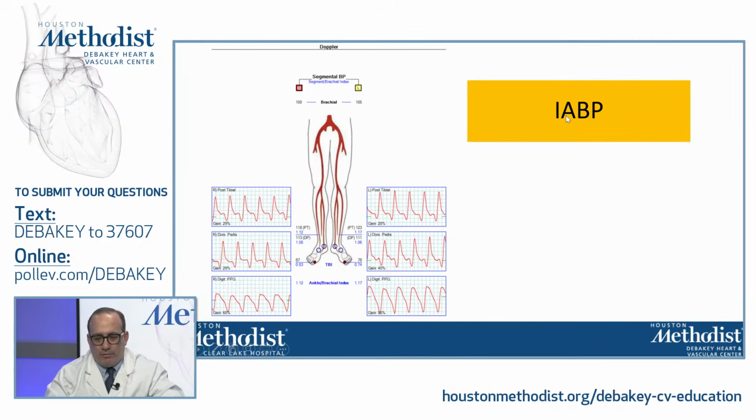Patient with an intra-aortic balloon pump. How do we know that? Well, we know by the history, and the other thing is you see this sort of elevation. This is the peak systolic waveform from the patient's contraction. Then it goes back to normal.